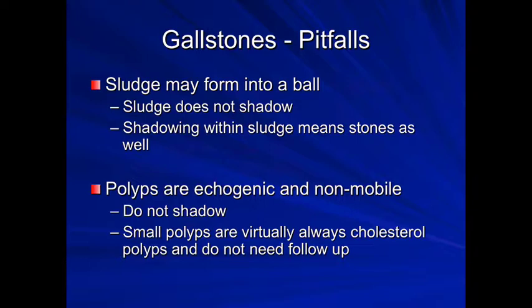Similar to sludge in appearance, although it's not mobile, are polyps. These are echogenic masses, and they are non-mobile. They do not shadow. Small polyps are common and are virtually always cholesterol polyps, and they do not need follow-up.